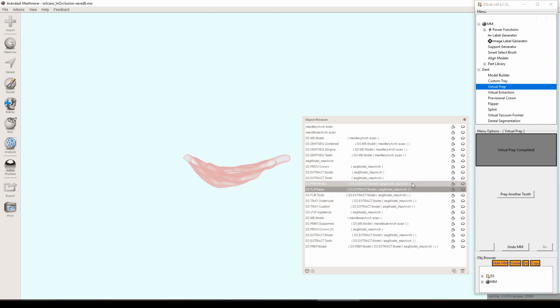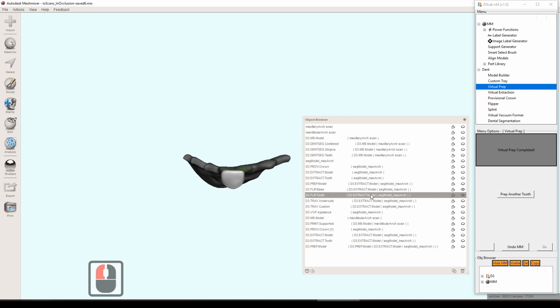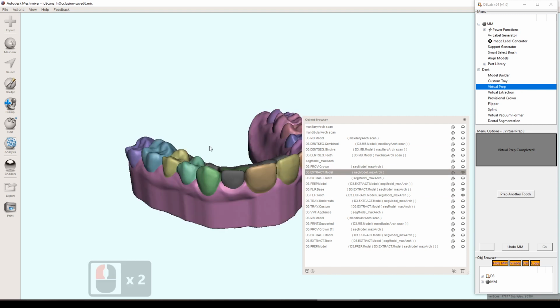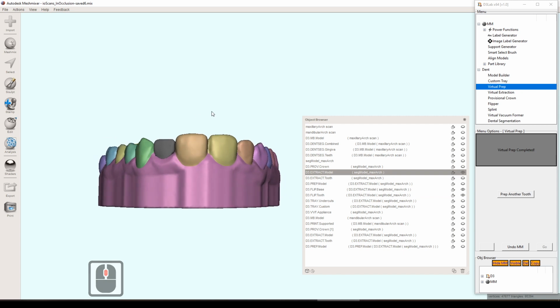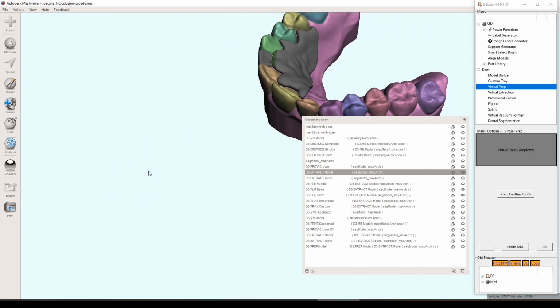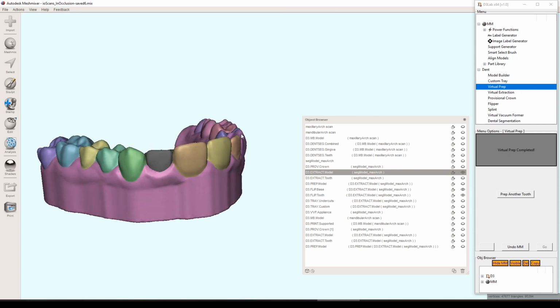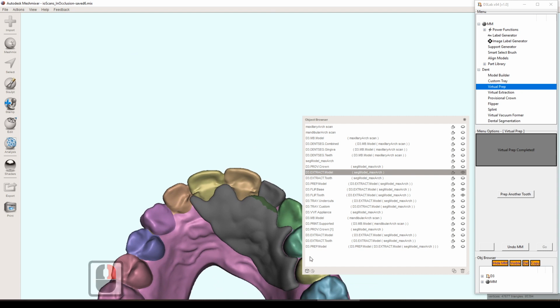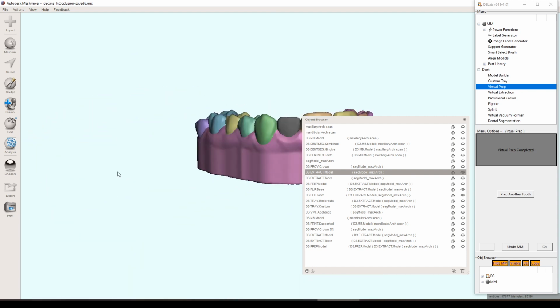And the flipper, like I said, there's that. I'll show you what that looks like on the virtual model. And see, this is nice because I can tell which model this was done on. It was done on the D3 extract model, seg model, Maxar, this guy. And there you go. And from here, you may want to do a little bit of tweaking, but like I said, this is a good starting point.